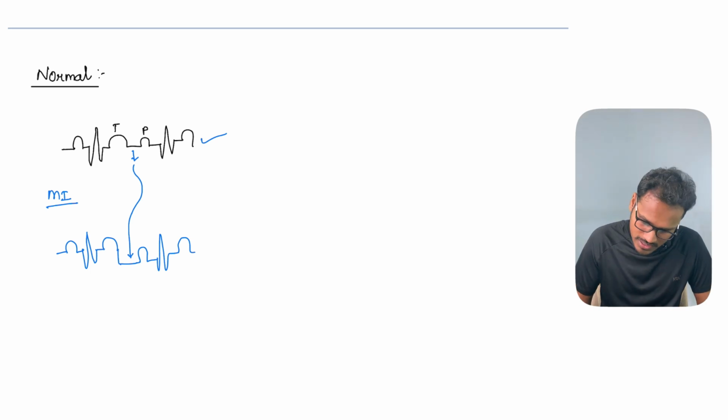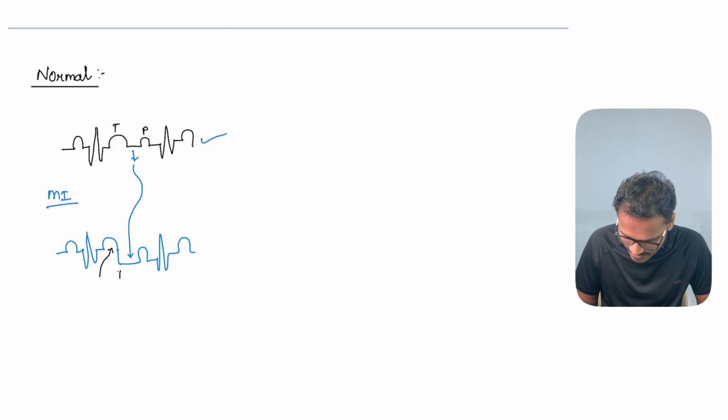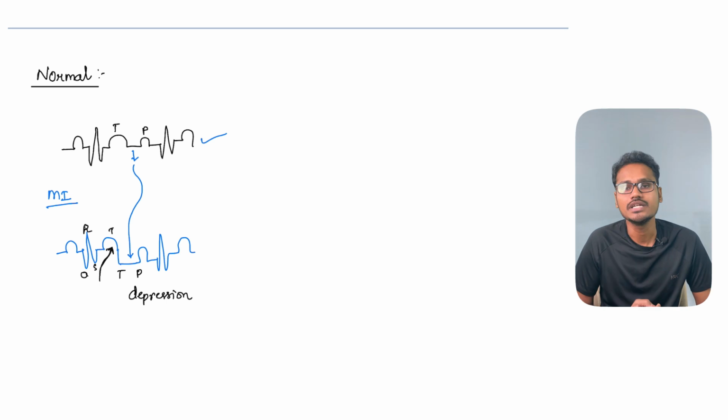If you look at this closely, again this image also is giving an ST segment elevation. So ideally a TP segment depression, when you look at the ECG also, as you can see here, QRST, this also looks like an ST segment elevation.